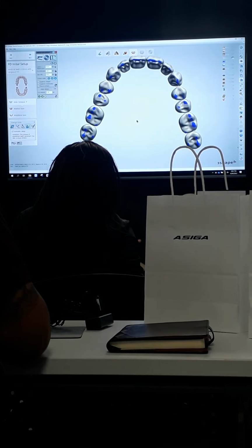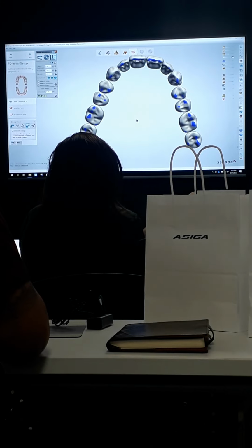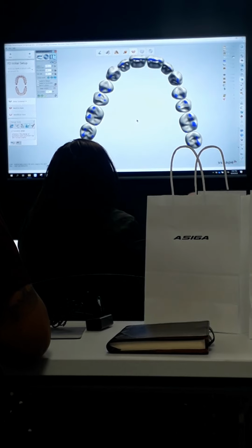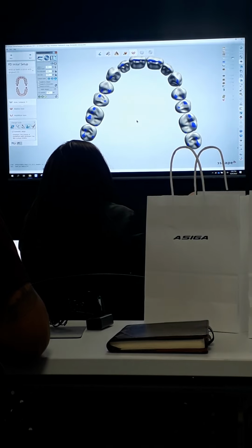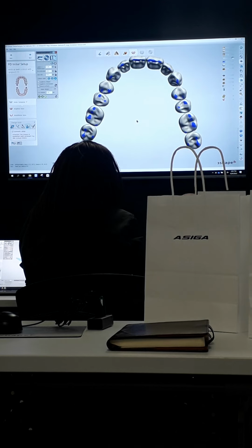It will then automatically align the bite based off of the mounting, and it also automatically aligns it to the same position in the virtual articulator. So you don't have to adjust that position at all. The virtual articulator is set up to function identically to the physical articulator, so it should match the movements. If you take that denture out and move it to the physical articulator and function it, you should see the same thing.